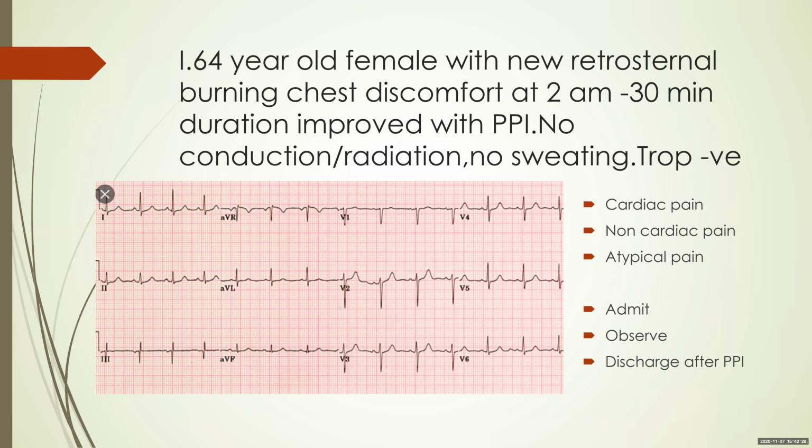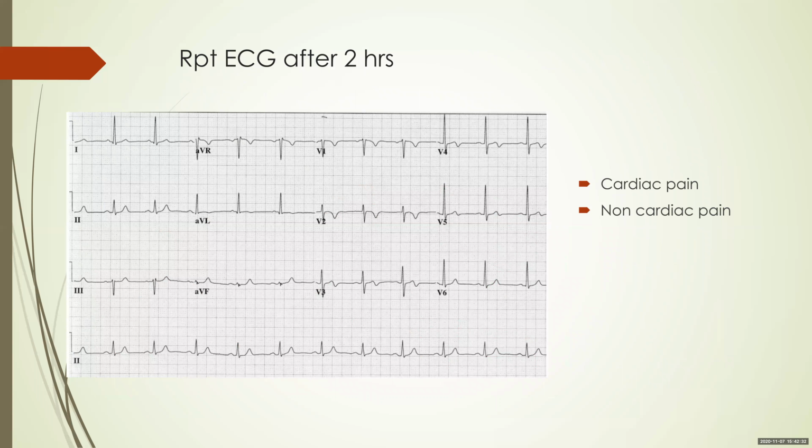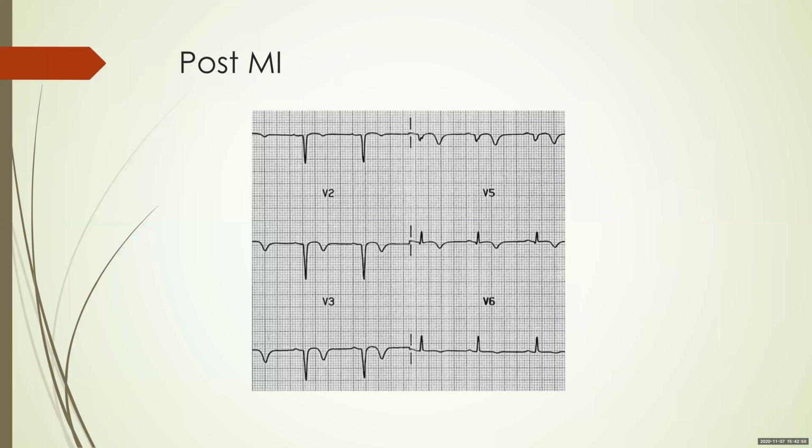So during the time of the chest pain, the T waves become normal or upright, and subsequently it becomes inverted. This is called pseudo-normalization. This is very suggestive of a coronary artery disease, especially in the background of a typical angina. So these T inversions are due to coronary artery disease, and this is actually a life-threatening condition, because if you don't treat this, within the next few weeks, he goes in for an extensive anterior wall MI.